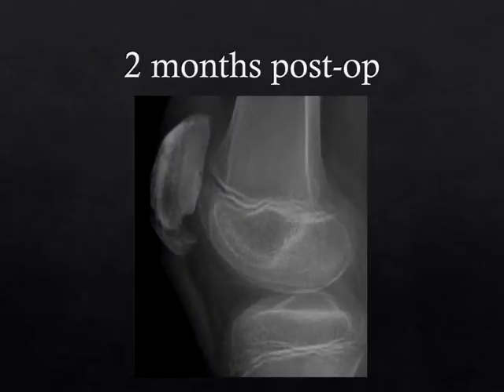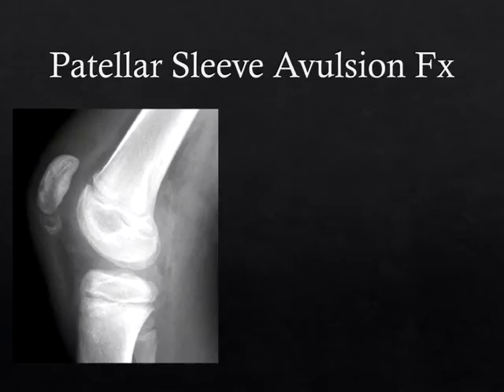So what they usually use is some sort of either radiopaque or radiolucent tension band construct. If it's radiolucent, you'll just see tunneling through the patella itself, and the two fragments will be opposed and heal together over time. But again, the inferior patella will look irregular forever.